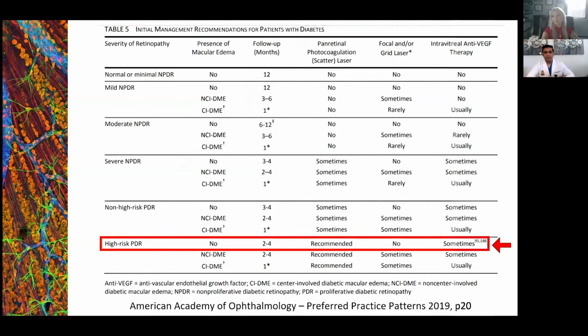And I agree. I think the first turnaround in this kind of patient, where the macula is relatively spared, is to hit those areas of non-perfusion and make sure we decrease the VEGF production to prevent them from getting macular edema. You absolutely nailed it, right? This is the guy who's 20/20. We've got to keep him 20/20. I completely agree with you.